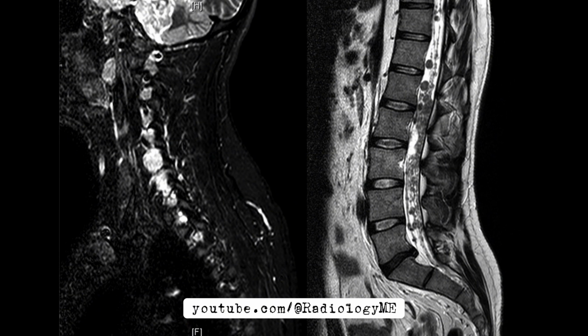Histologically, schwannomas are usually isodense with brain parenchyma on non-contrast imaging, but they tend to show strong enhancement after contrast administration. Interestingly, in larger tumors, there may be ring-like enhancement due to central necrosis, although calcification is rare.